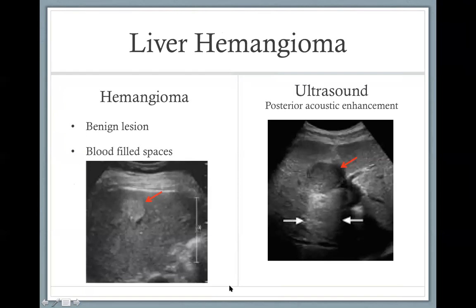Liver hemangioma is also another benign lesion. And again, not uncommonly seen. But in patients who have symptoms or another malignancy, the question is always: is this hemangioma or cyst, or is it metastasis? Ultrasound. I'm not sure if you have gone through liver lesions with Dr. Jawed, but in general, ultrasound is a good start.